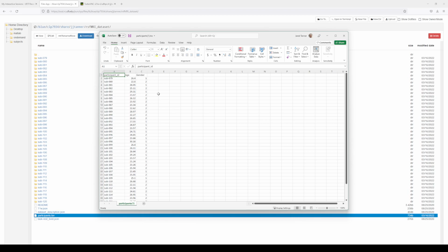But really we can do 2 things with this. So if we want this to be a covariate in analysis, we can leave it as it is. If we want to use this as a grouping variable, meaning if we want to be able to really directly compare male and female, it's best if we set it up like this.